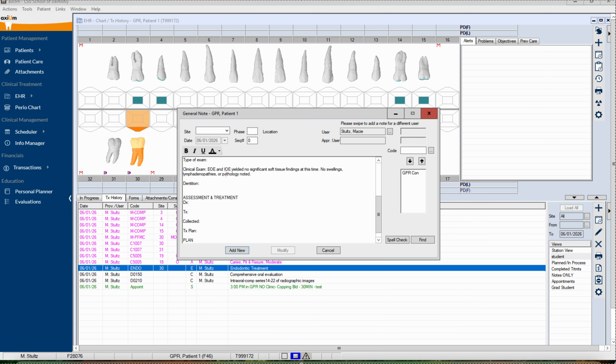Okay, so down here you can just quickly look, it says F46. Just a female, 46. Her chief complaint: take care of my teeth and I keep getting food stuck. Right.